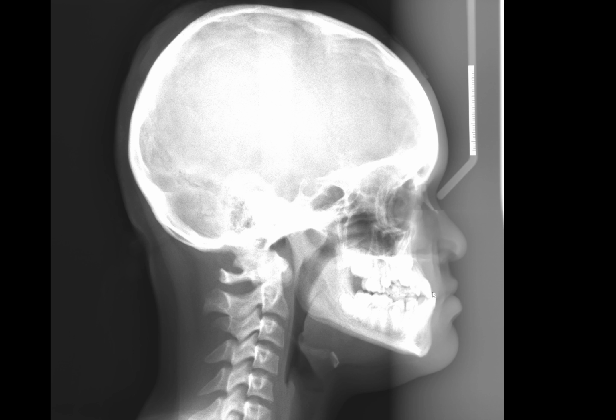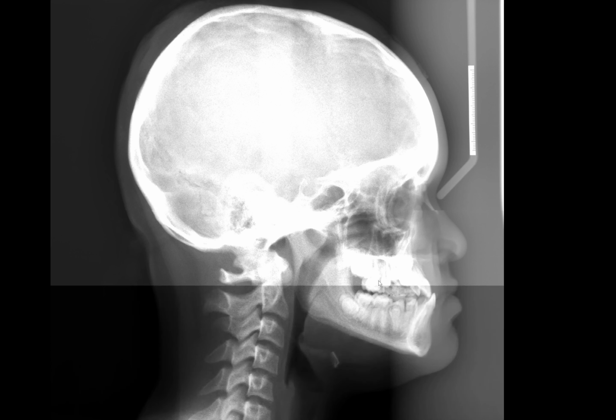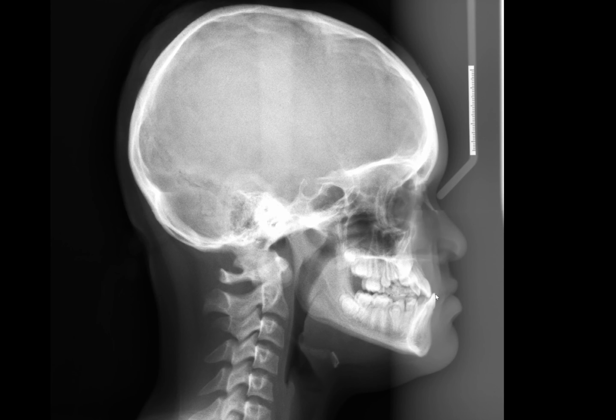the patient has a malocclusion in the anterior maxilla where there's a crossbite, as you can clearly see. I can probably adjust the contrast to bring out the crossbite a little better. And then we see a tremendous amount of anatomic information. Obviously, we tend to focus our eyes a lot on just this area, but just keep that in mind. There are a wide range of pathologies and different conditions that can involve the cervical spine and the paranasal sinus, and rarely, but it does occur within the cranium as well.